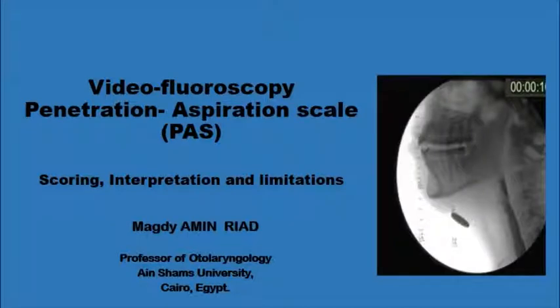Assalamu alaikum. This presentation is on the identification and quantification of aspiration by the use of videofluoroscopy, the gold standard, and a special validated scoring system, the Penetration-Aspiration Scale (PAS), which is also now the gold standard for the quantification of aspiration. We'll go through the scoring, how to interpret it, and the limitations of the scoring system.